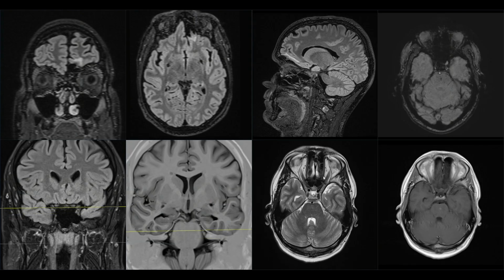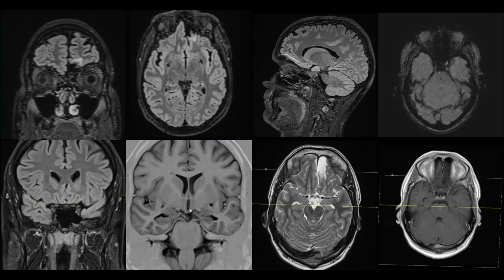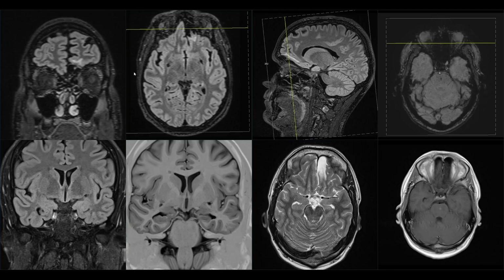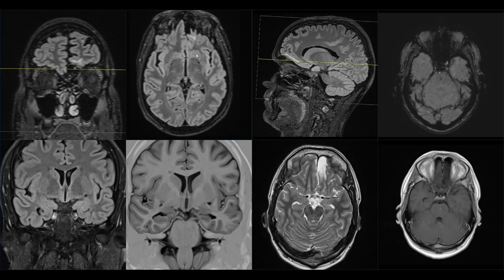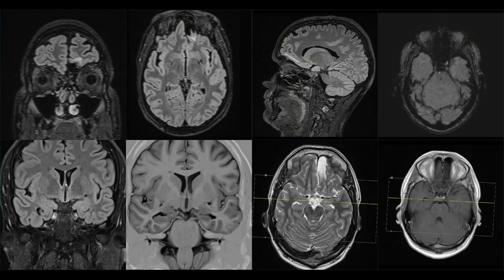finding visible on the T2 weighted imaging. Now, the possible scenario could be that the patient was originally with mesial temporal sclerosis and has developed epilepsy with seizures, and during such seizures with rapid head movement, there have been contusions of the base of the frontal lobes, which is a common location for such contusions. So this can be secondary to epilepsy insult.